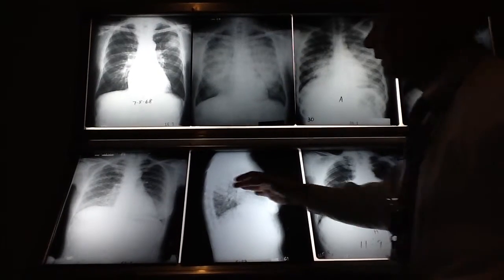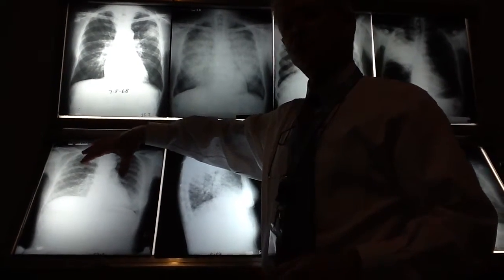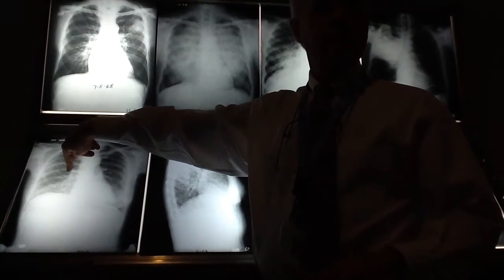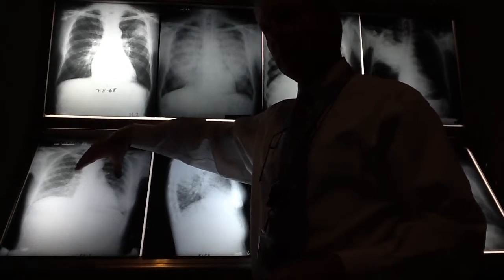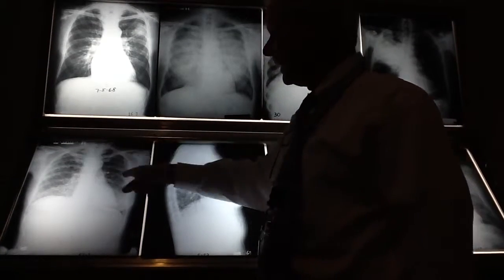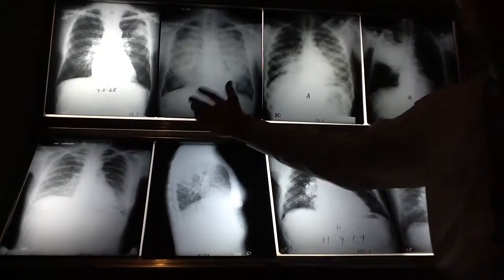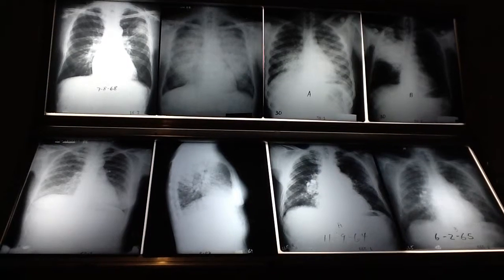It doesn't have to. Now, this is characteristic of interstitial disease. This is thickening the wall of the water bottle that we talked about the other day. Okay? This is thickening the wall of the water bottle. Nothing wrong with the airspace. Still plenty of air. That's why there's still radiolucency, and that's why we get non-homogeneous increase in density.